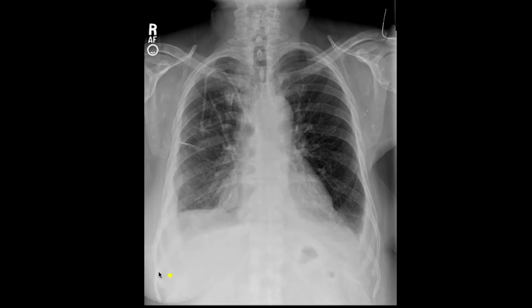So in this patient, you can see the right breast shadow down here, and you can see that there's normal soft tissue density within the patient's axillary region, but you can't appreciate a breast shadow on this side. You've also lost the soft tissues here, and the patient has some surgical clips in her axilla, so the patient has had a mastectomy on this side. The patient also has a tunneled port, so the patient is almost certainly getting some form of chemotherapy.